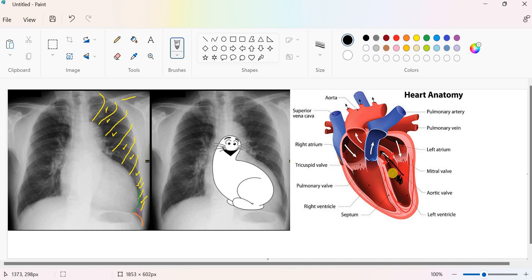When the following cardiac cycle comes and the left atrium is trying to pump blood to the left ventricle, now you will have the volume coming from the left atrium plus the regurgitated blood from the prior cycle. So this is considered as volume overload. I am having extra volume that the ventricle should accommodate. So again, this will lead to left ventricular enlargement. So in case of aortic regurg, aortic stenosis, or systemic hypertension, this might happen.